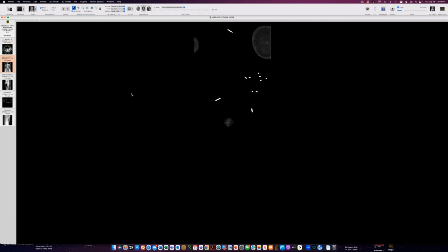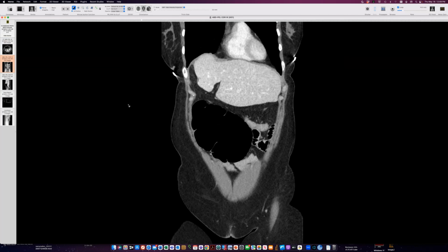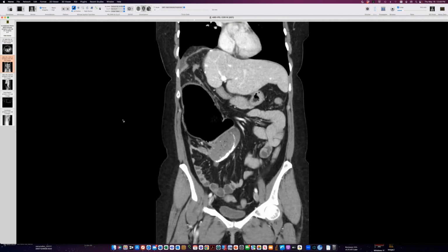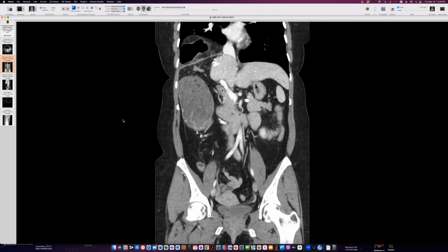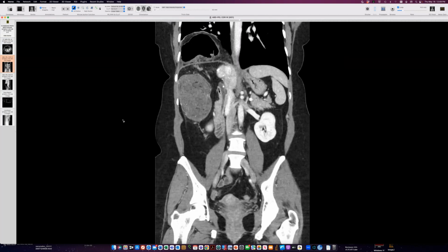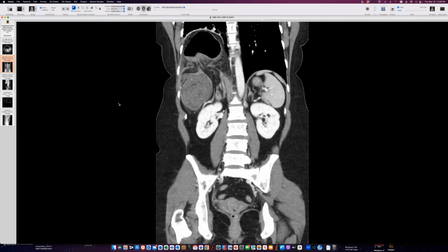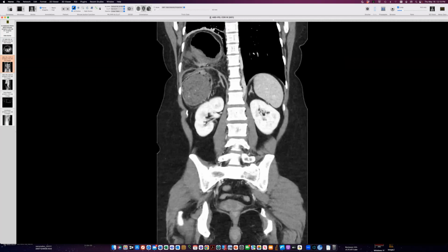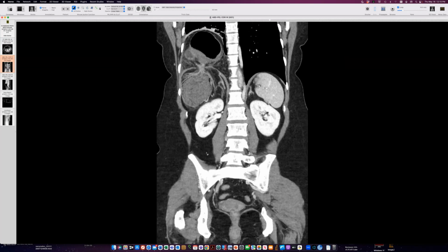At this point, she has abdominal pain, and she has developed a hernia in this right hemidiaphragm containing colon, which is distended and was obstructed. You can see the vessels here in the fat and the edema in the fat here streaming through this defect. So this is an iatrogenic hernia of the right hemidiaphragm following this partial hepatectomy.